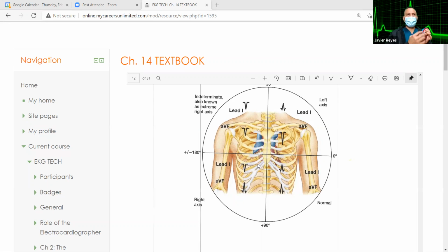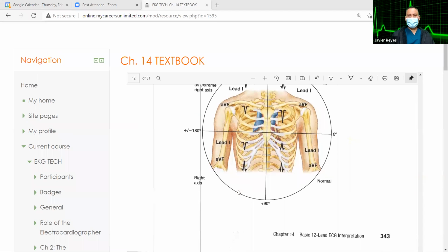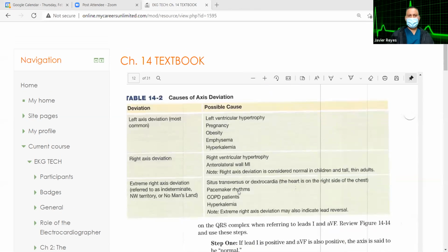I know it's a little hard to imagine, but you have to use your imagination. Imagine the flow of electricity shifting from one side, moving around. It's not the heart that's moving, it's just the electrical signals that are coming out from the muscle, and they're captured in the machine in a different way because of the enlargement of the walls. We'll look at some examples.